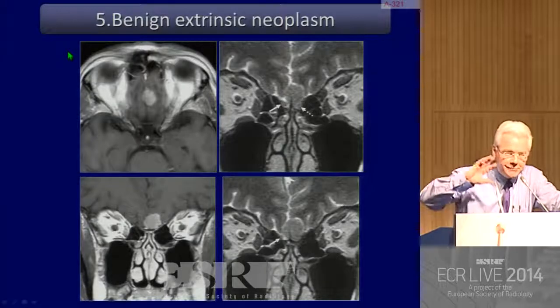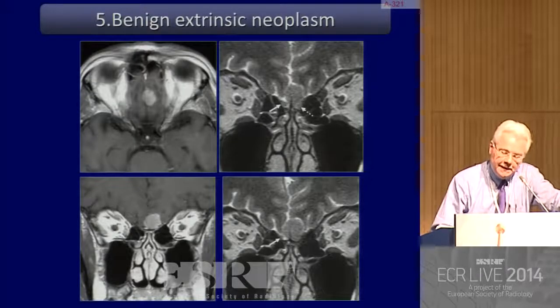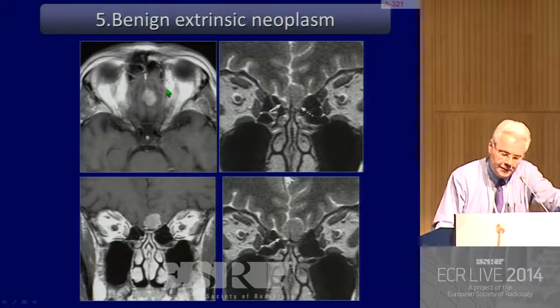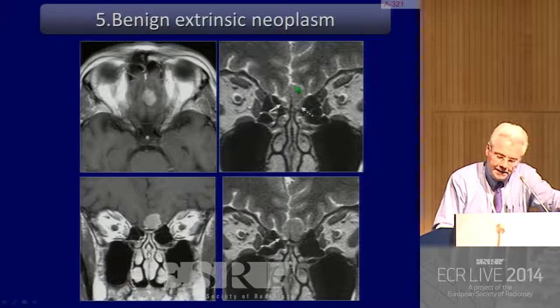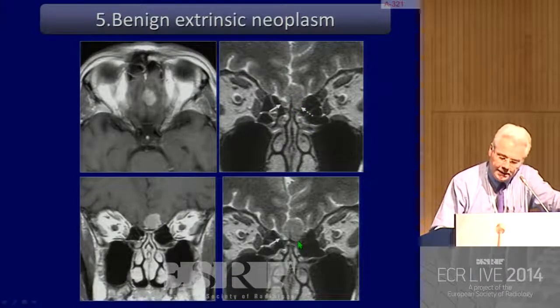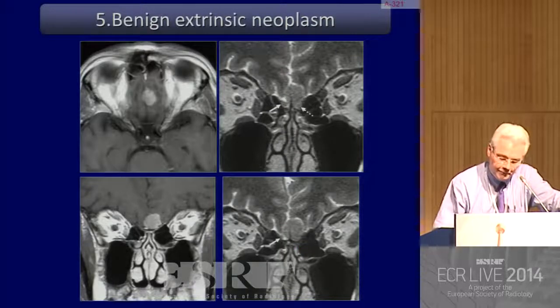At the other extremity of the scale of severity, you have another paradigmatic condition, which is the meningioma of the olfactory groove, a well-known pathology. And this is very interesting. This meningioma was impinging and thereafter completely encasing the left olfactory bulb.